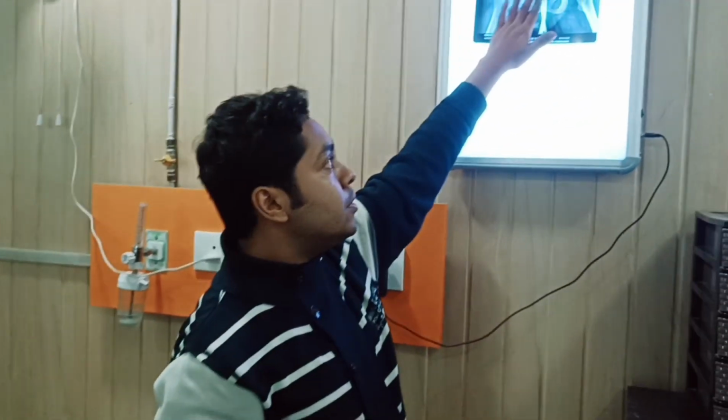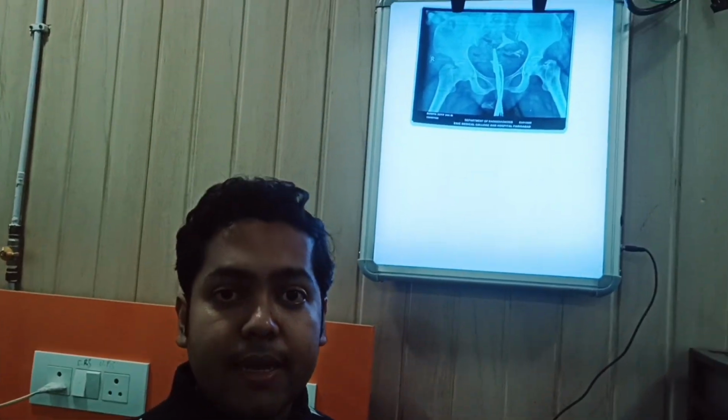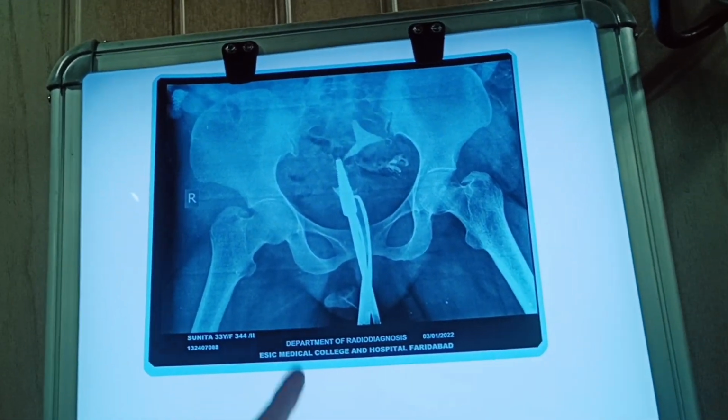Now you will be asked in examination how the management of this patient will be. So you should say that if there is one-sided patency present, then the patient can go for normal conception or the patient can go for intrauterine insemination as per the protocols. But if bilateral tubes were blocked in this patient, sometimes a patient comes with bilateral blockage of the tubes, then in that case you will say that the patient might have cornual spasm leading to tubal blockage.